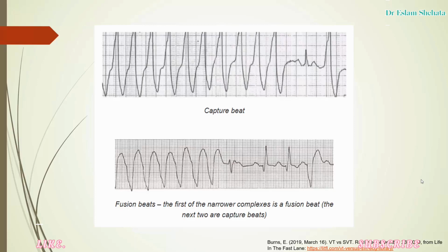I've never been able to capture an example of this myself. People are usually pretty busy resuscitating the patient, too busy to do a 12-lead ECG in these cases, so I've got this example from Life in the Fast Lane, and I will briefly say that I've never seen such an extensive collection of ECGs, and it really is a great online resource if you'd like to do further reading.